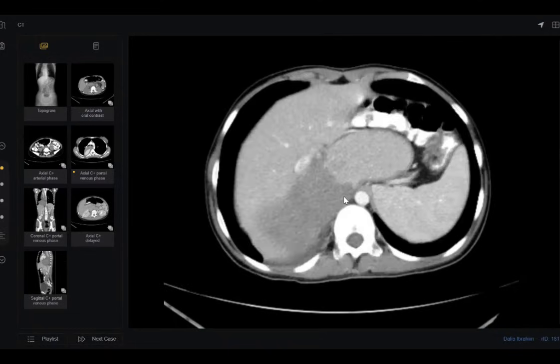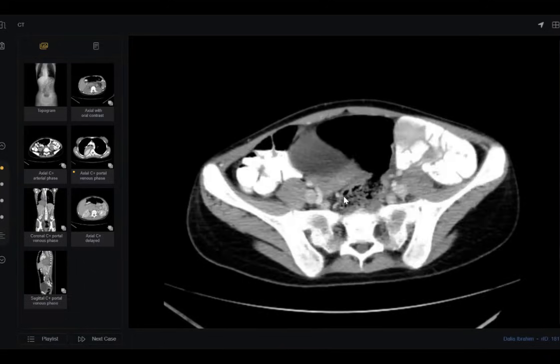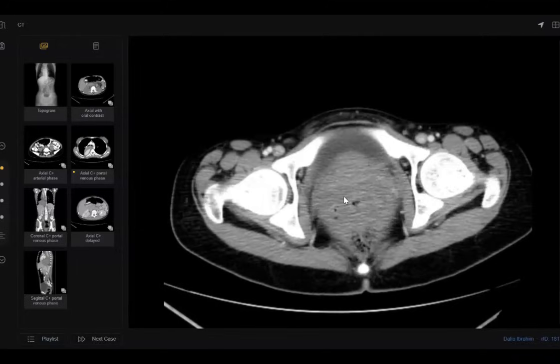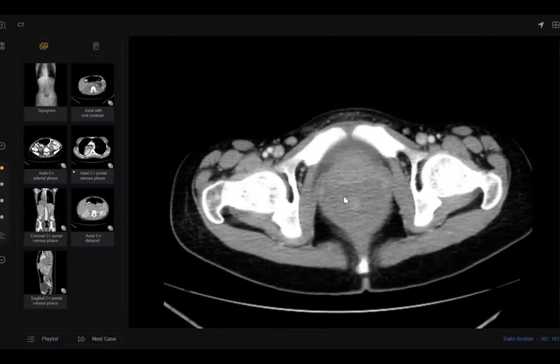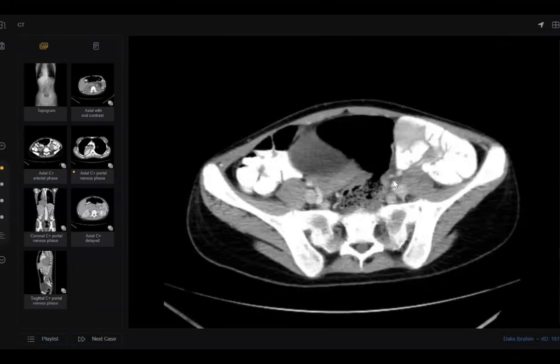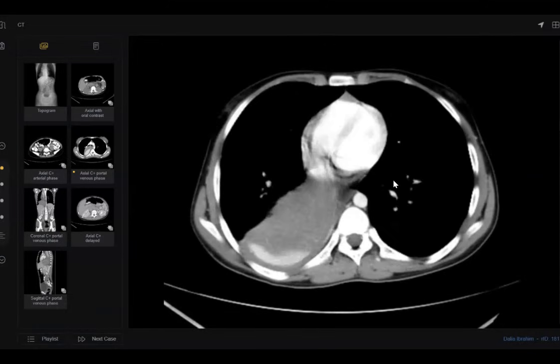Go on. What do you think? So this patient who is presenting with dysphagia has severe dilatation of the esophagus in its entire extent, from the thoracic esophagus down. I'm not able to see any filling defect. So it could represent achalasia, a primary achalasia. Are you sure?